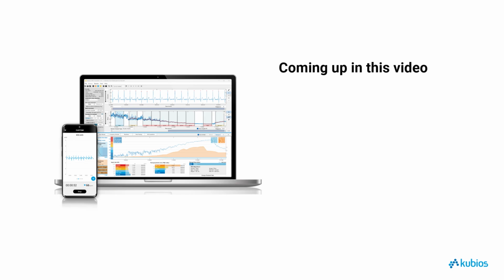In this video, we're going to walk through the standard tests used to evaluate autonomic nervous system function. These include the Valsalva maneuver, deep breathing, and the head-up tilt challenge, often referred to as the Ewing tests. We'll be breaking down each of these tests and demonstrating how to analyze the data obtained.